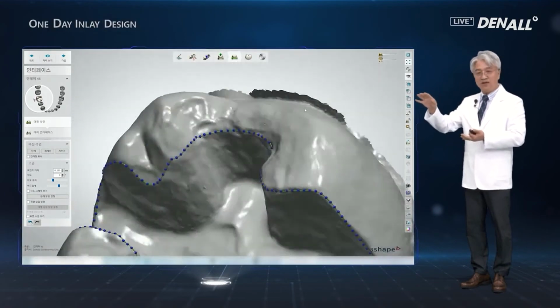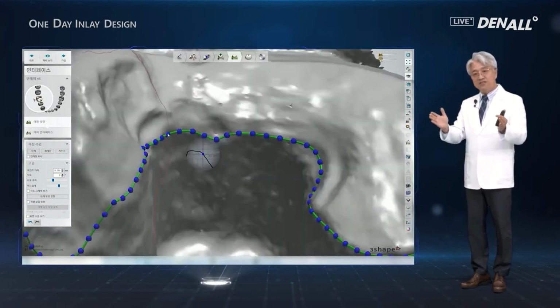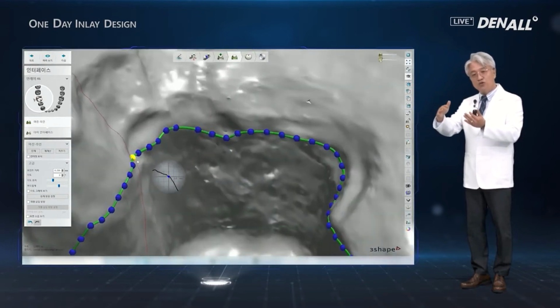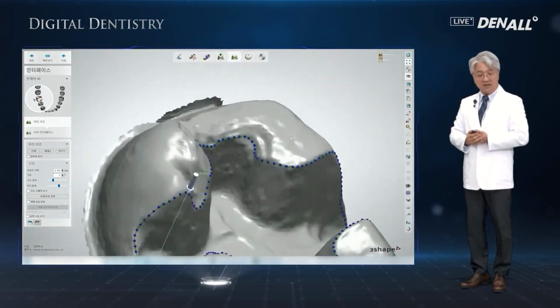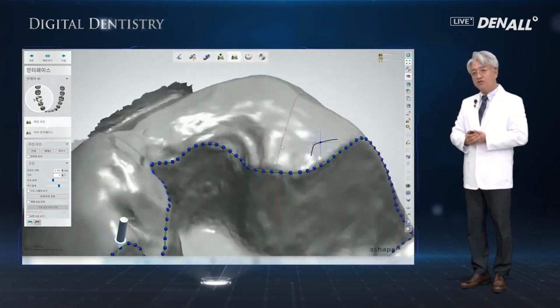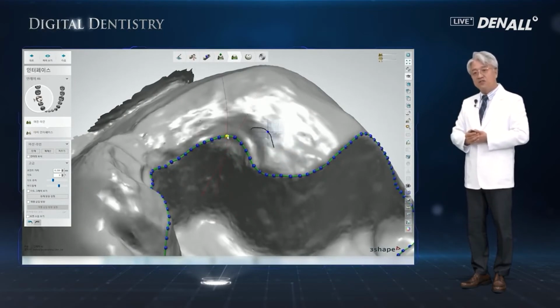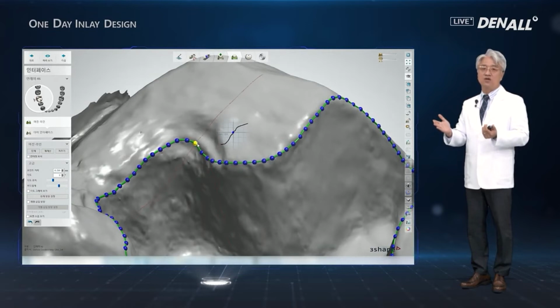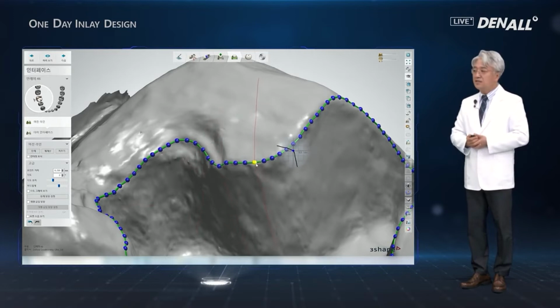But with the margin setting, with this enlarged image, the CAD system can now distinguish this up to a very detailed level. It has become that precise and accurate. So the inlays made with the CAD system are very precise. It's really clinically has very good results. So it has become a very dependable solution.